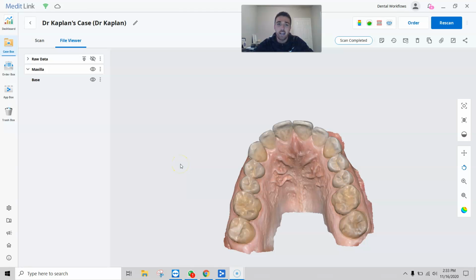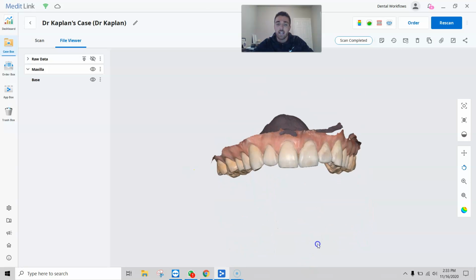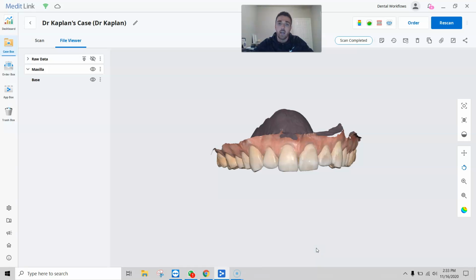Hey everybody, in this Medit i500 video tutorial, I'm going to show you how to export files. In other words, how can I take this patient record and export it outside of my Medit Link app? Now, why would I want to do that?